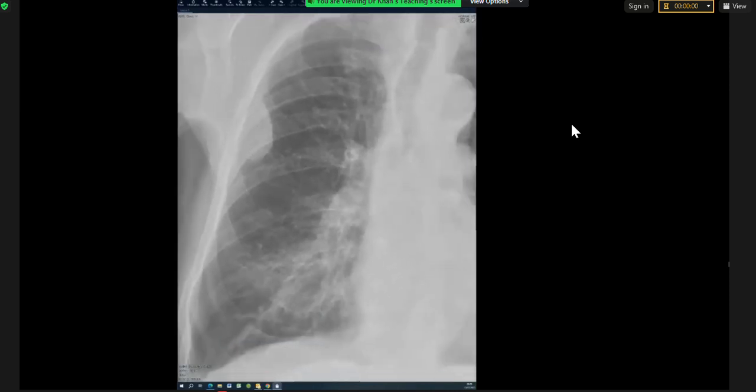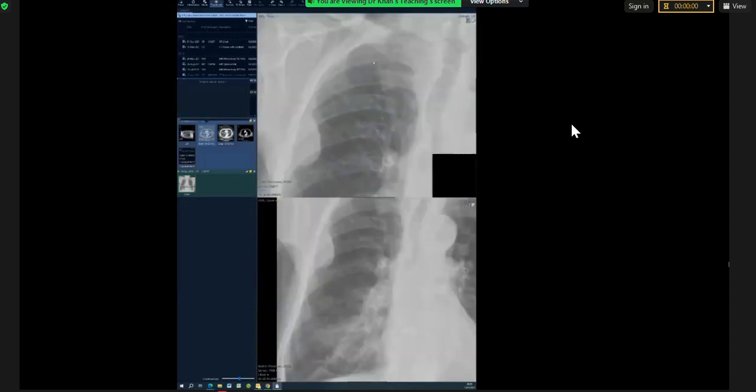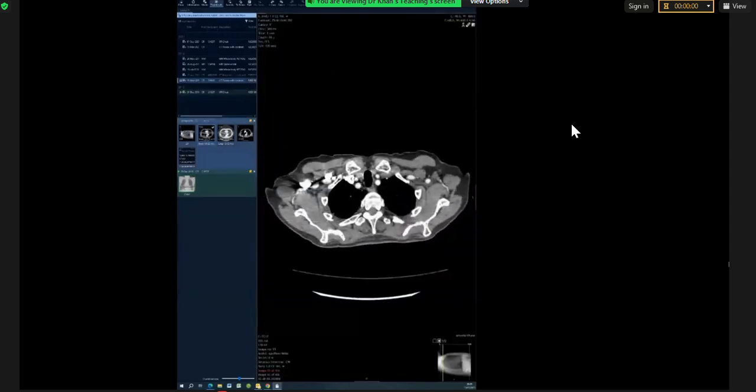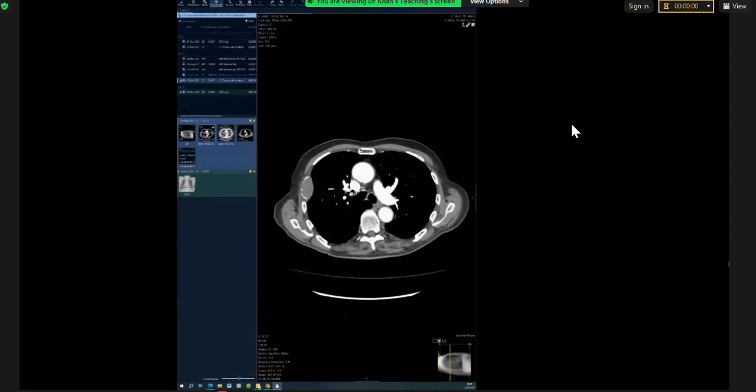A repeat of the same thing. And I'm glad I checked you. You made the same mistake again. Yes. You have to pick the bone destruction. If you pick the lesion. Yes. I could not appreciate that, but I will look into practicing it.